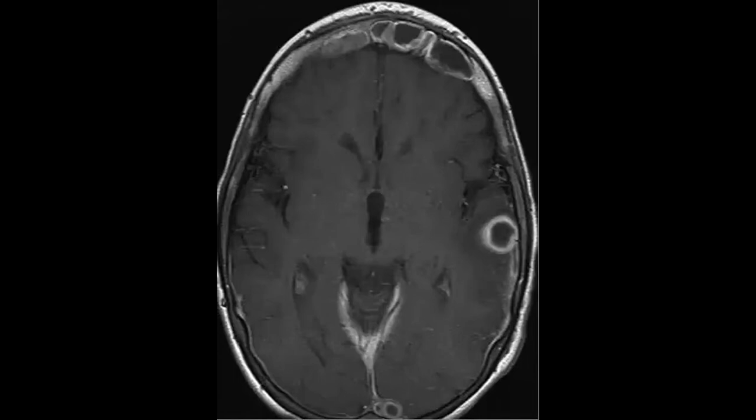Left temporal again, and it has, if you want to describe it in terms of MRI, we'll mention that it is a ring enhancing lesion. Do you agree with me? Yeah. Huda, Muayyad, nice Muayyad, welcome. Nice suggestion. And abscess, empyema. Okay.